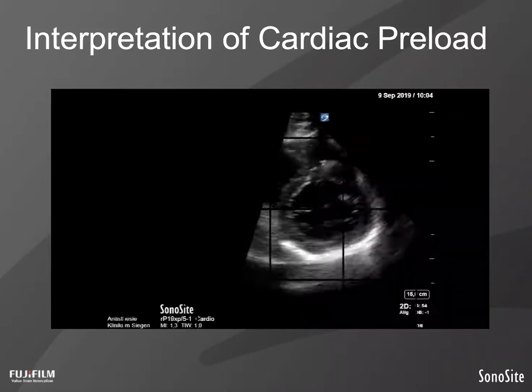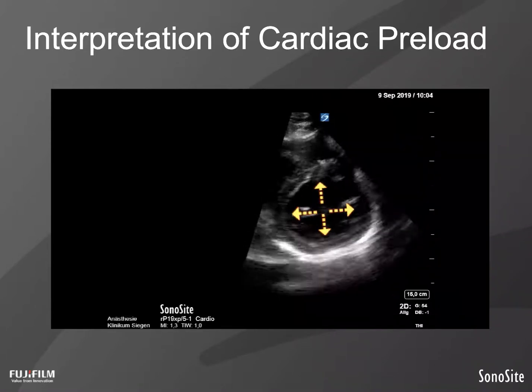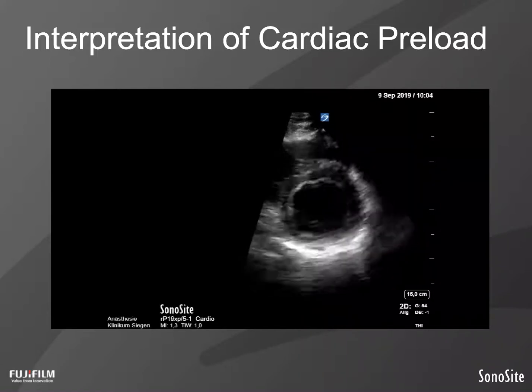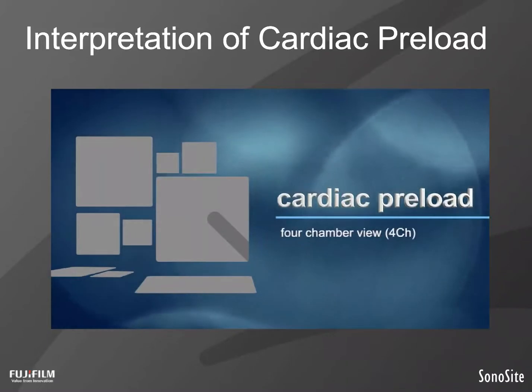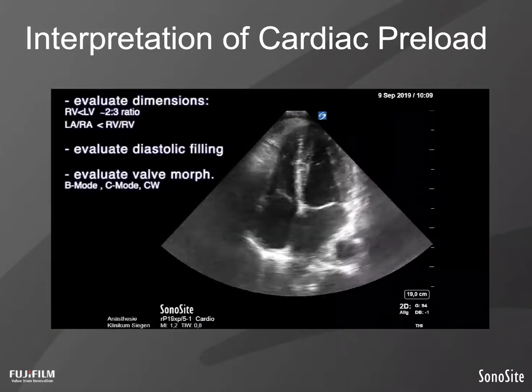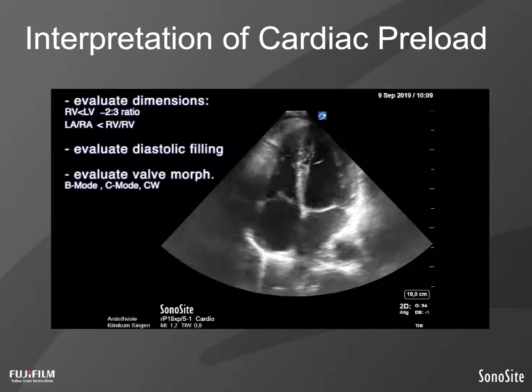Again, you have to focus on the systolic and diastolic cross-sectional diameters. In particular, you have to search for end-diastolic persistence of myocardial wall movement. In the four-chamber view, you have to follow the same algorithm. You have to evaluate shortening and thickening and cross-sectional diameters.